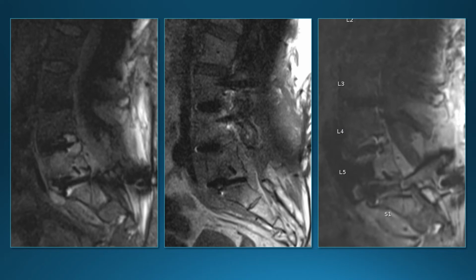So now this was his MRI. There's a lot of artifact from the hardware, but maybe this is best seen on the non-contrast T1. There was a lot of prevertebral soft tissue thickening as well as epidural soft tissue thickening. Post-contrast, this enhances with contrast. I know there is a lot of abnormal bone marrow signal, but you can see the abnormal bone marrow signal just from the surgery. But when we saw this prevertebral and epidural soft tissue thickening, we're very concerned about infection.